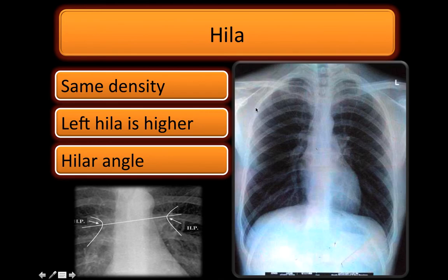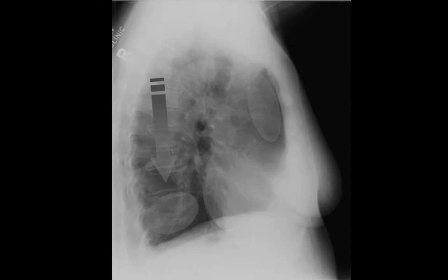if you see that there are some vascular expressions going upwards and some vascular expressions going downwards. Also on this side there are some vascular expressions going this way and some going this way. So if you draw an imaginary line this way, this angle is the hilar angle. This is very important because when there is some abnormality, the angle is not maintained, or the angle is blunt, or sometimes they are widened or something like that. I will discuss it when I discuss the pathological cases.